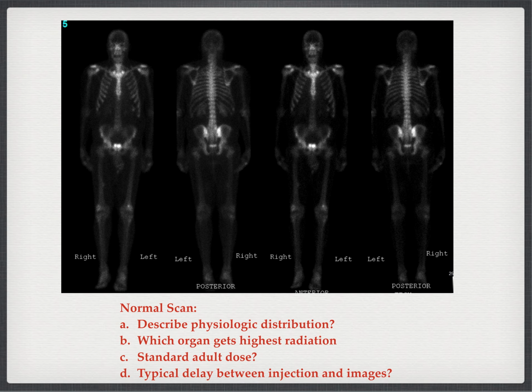All right, so this is how the scans look. Anytime in radiology we can show a skeleton by itself, I think it's a huge plus, and with other tests than bone scan to demonstrate the bones of a skeleton.